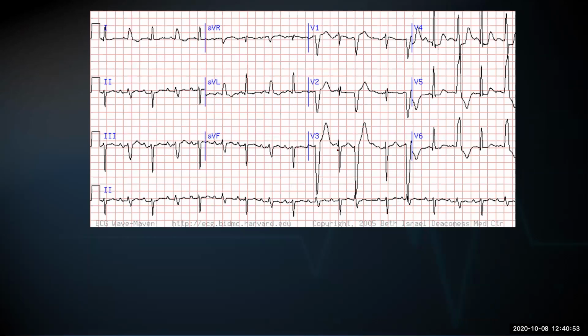And then if we looked, since we're in the fascicular block section, we already know though that it looks like there's an appearance of a left bundle branch block here. We don't see the rabbit ear, so we know it's not a right bundle branch block, but it definitely does have the deep S in V1, V2. It looks like there's some reciprocal ST elevation in there just to kind of keep an eye on.